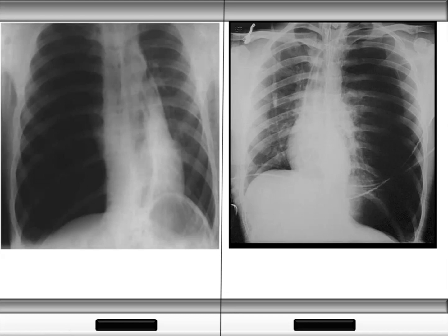These are tension pneumothoraces. Now, in this case, it has started to push the central structures across midline. So here on the left, this is all a pneumothorax, okay? And in this case, the cardiac structures have all been pushed this way, and the trachea is beginning to go away from midline. Here again, all pneumothorax, the trachea is here, and everything is pushed across midline.